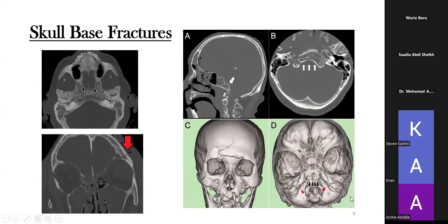So how do you know if there's crowding over here? Normally, when you look at a scan, I'll show you in future scans, there's a good hypodense area around it. That is what we call a CSF cleft. If the CSF cleft is absent at the level of the foramen magnum, then you definitely have to consider that there's crowding over there.